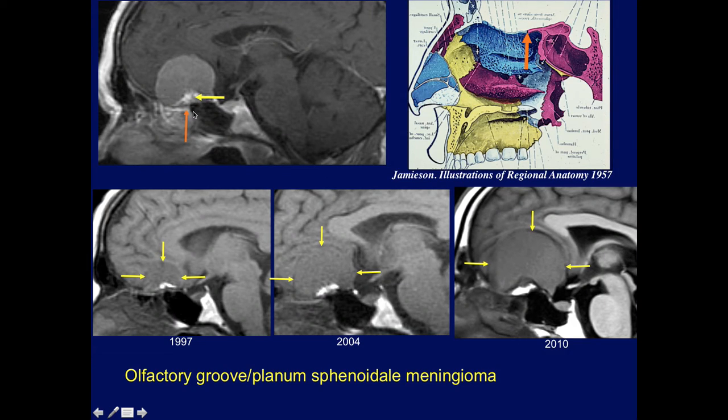And again, another case showing the hyperostosis, which occurs, as I mentioned last week, in the suture between the sphenoid and the ethmoid. That is the sphenoethmoidal suture. This is where the ossification or the calcification starts, and notice the tumor grows around it.